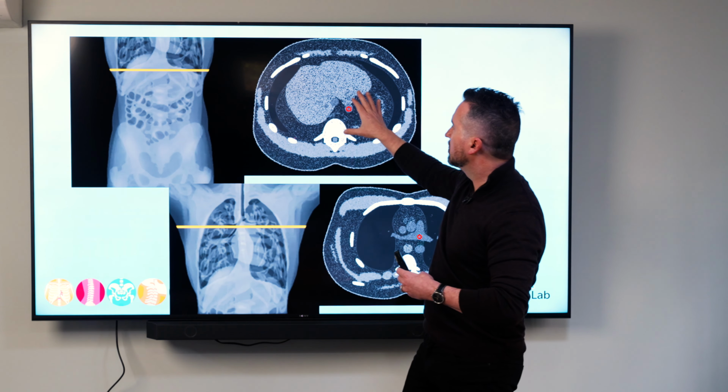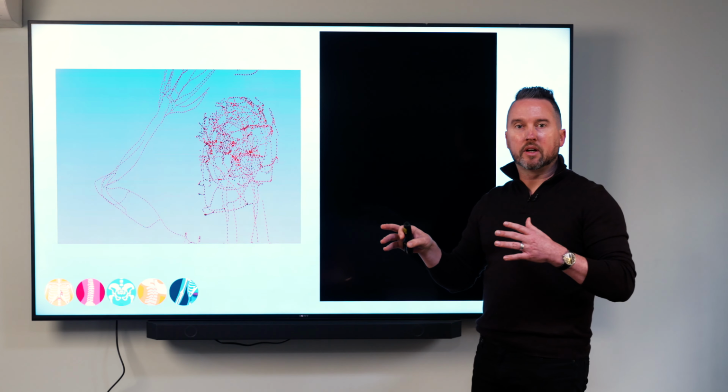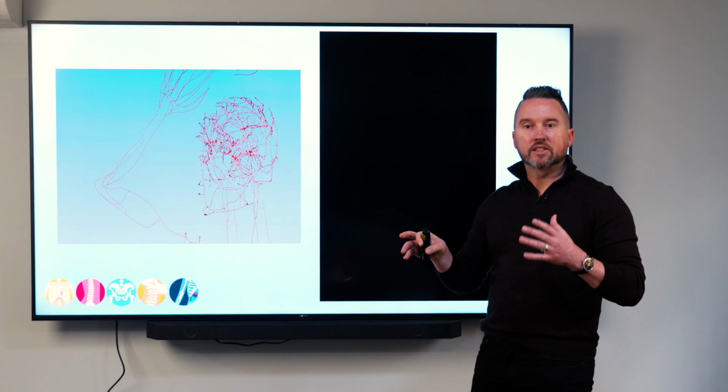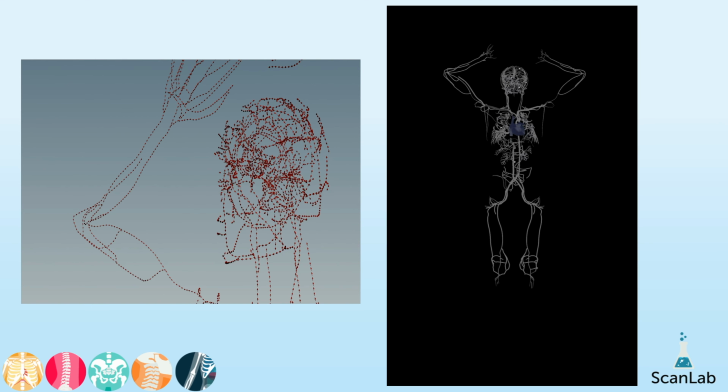The next challenge, because one challenge just leads to another challenge, is we wanted to start to program the cardiovascular system. So could we go through the arterial side, for instance, and tell the blood which way we think it should be flowing? What that allowed us to do is take our digital contrast and actually watch it move through the human. And we were all very excited about this.